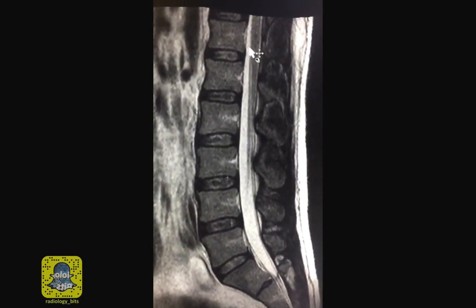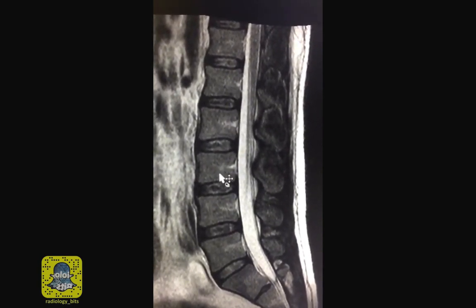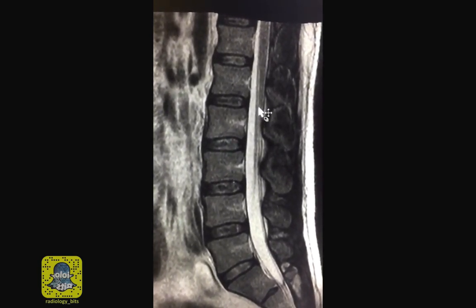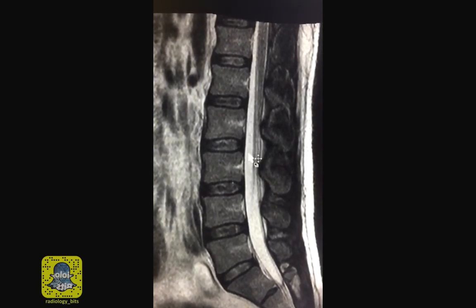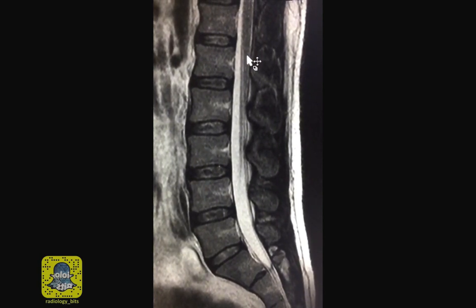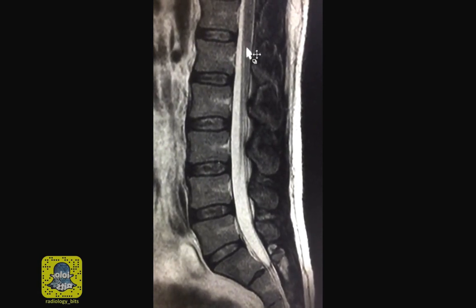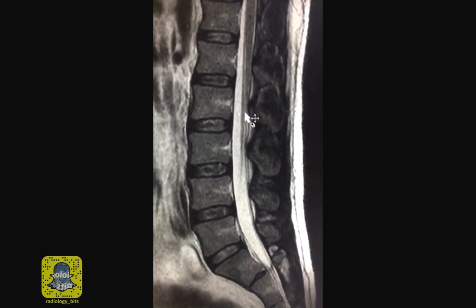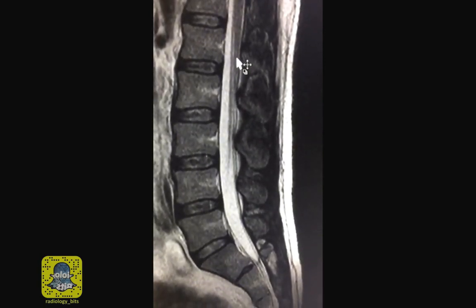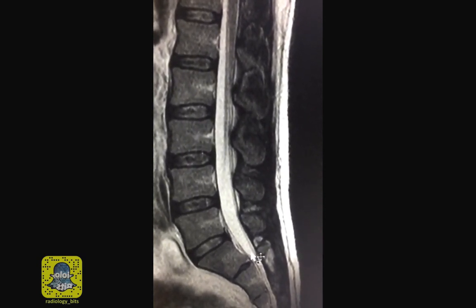Now that you know your sagittal T2 anatomy, going over this quickly: the vertebral bodies, namely the lumbar vertebral bodies, intervertebral disc, posterior elements, CSF-filled thecal sac that appears bright on T2, the spinal cord terminating in the conus medullaris at the level of T12-L1, distal nerve roots that simulate the horse's tail, known as the cauda equina, and the thin cord-like connective tissue line that connects the end of the spinal cord to the end of the thecal sac, known as the filum terminale.